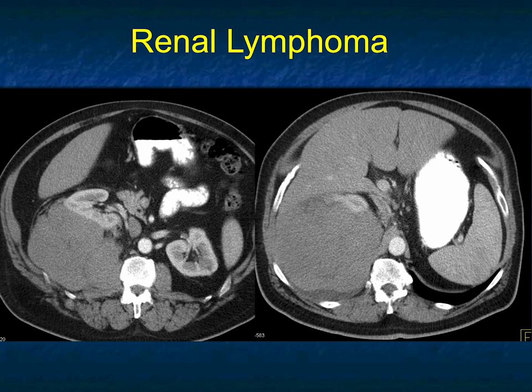So to me, oh yes, other things in the perirenal space, extramedullary hematopoiesis, but that typically infiltrates the entire kidney, and usually it's bilateral, and the spleen would be enlarged. Also things like Erdheim-Chester disease, infiltration of the perirenal space, but again, that's 360 degrees, and that's not the case here. Just a terrific case.